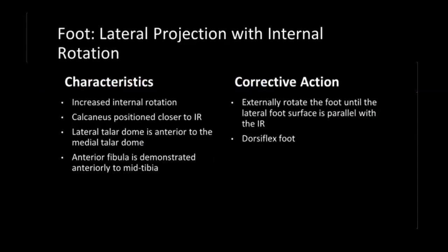Here are the characteristics of that relationship and the corrective action.